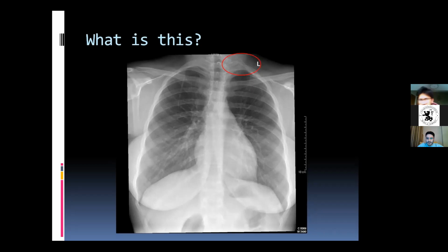Remember, look at the features. Are there any features of the ends causing sclerosis? No, there isn't. There's just a blunt ending. You're right. It might be the first rib, but is it really the true first rib? Am I confusing you more and more now? Right. I'll just wait for Amir to frantically stop. An extra rib, exactly.